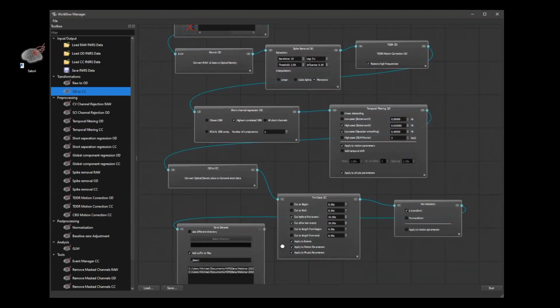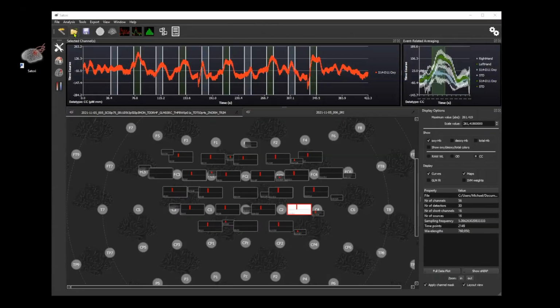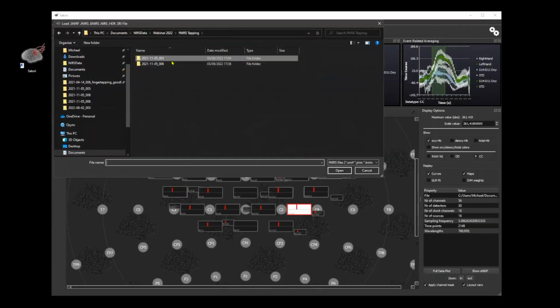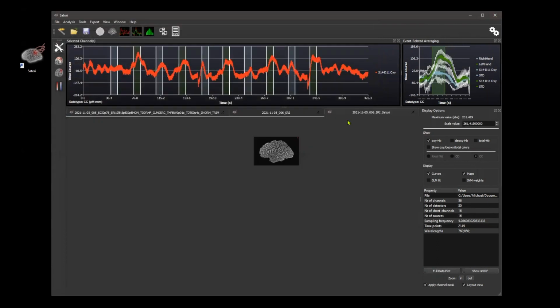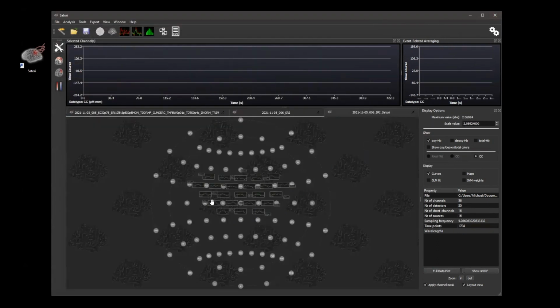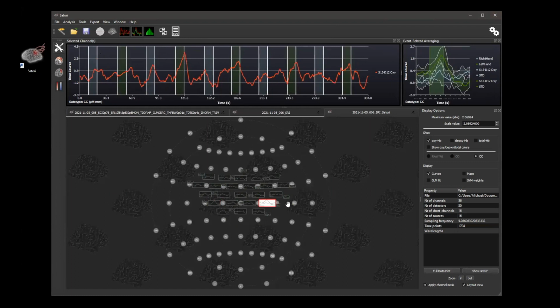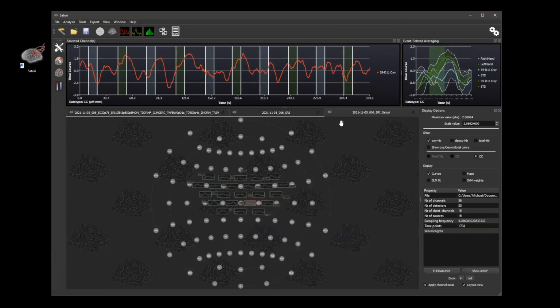So these files are now there. They are stored here with the underscore Satori. So we can just open the data set, this one with underscore Satori. And then you can see the data set as preprocessed data, including the different channels with the parameters that we have just set. Okay, so we are now ready to do the multi-study GLM, so to combine these two runs.